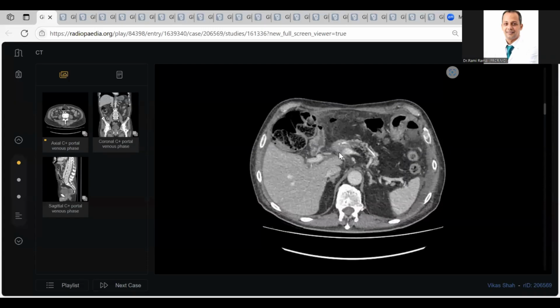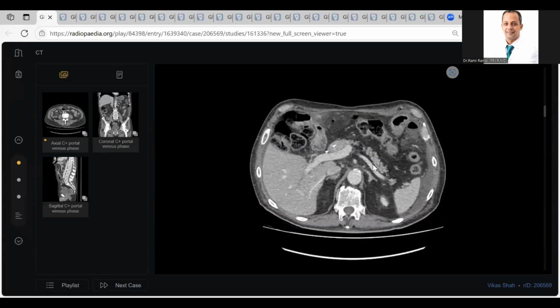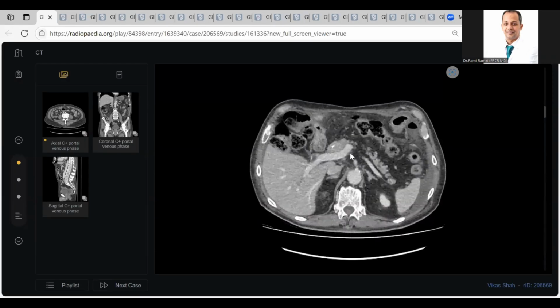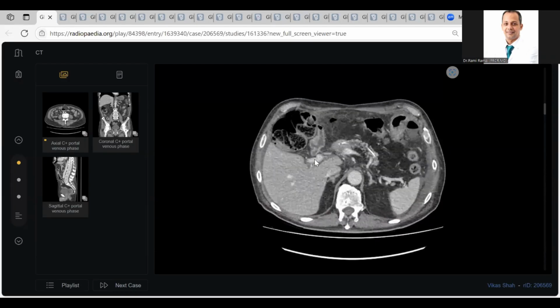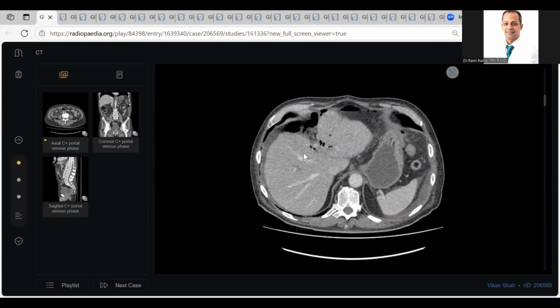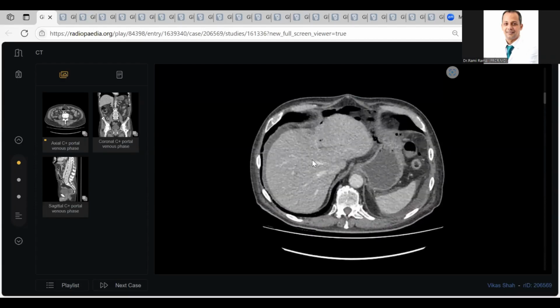I'm just looking at the rest. Okay, this is pancreatic stent. Will not make pancreatic, the patient die. Stop here. What happened here? I think there is pneumoperitoneum.